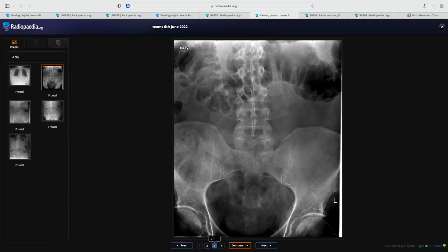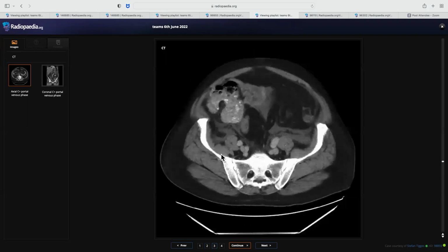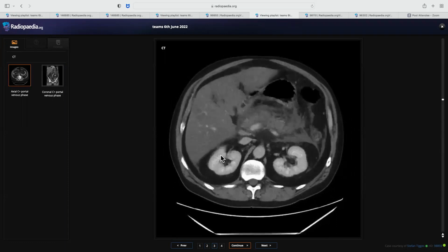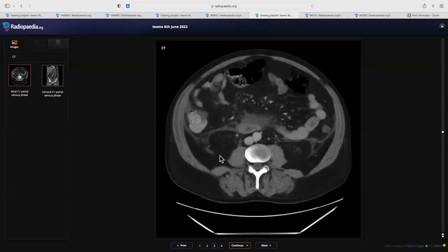So yes, acute pancreatitis is a very common cause. Other causes would be CA colon and inflammatory bowel disease, or even ischemic bowel disease is one of the causes. Ischemia is, as Dr. Curtis always says, we usually forget the word ischemia in bowel. So that is one thing we should remember. Pancreatitis, of course, is the most common cause. So you do see in CT that it's confirmed that it's pancreatitis. So that is the cause of colon cutoff sign in this patient.